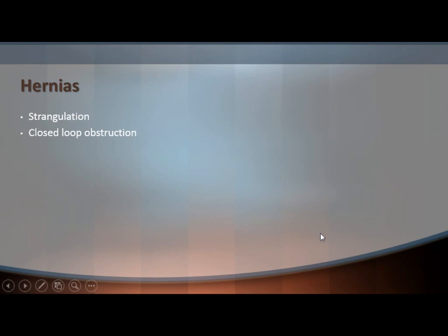Okay, hernias. My colleague talked about hernias, so it's logical that they may cause obstruction. Whenever the blood supply is compromised, it's called a strangulated hernia.